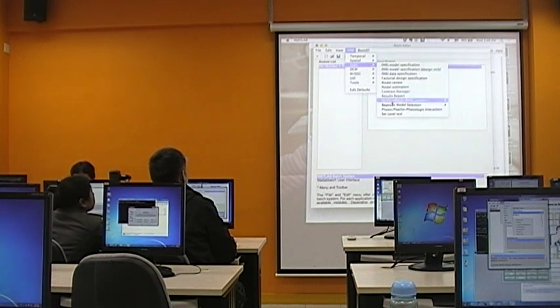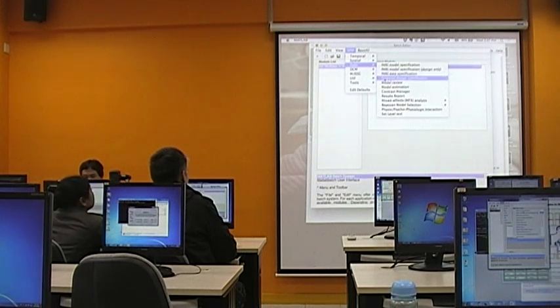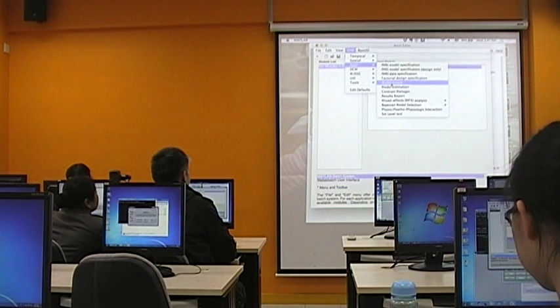So we are going to cover some of them, but not all, because mainly for first level analysis, what you are going to need is to do fMRI model specification. This is the first level model. For the second level model, you would do factorial design specification. And there are some functions that might be useful for you.